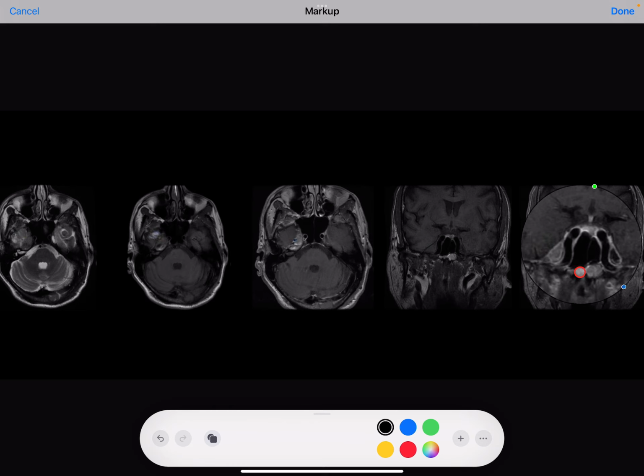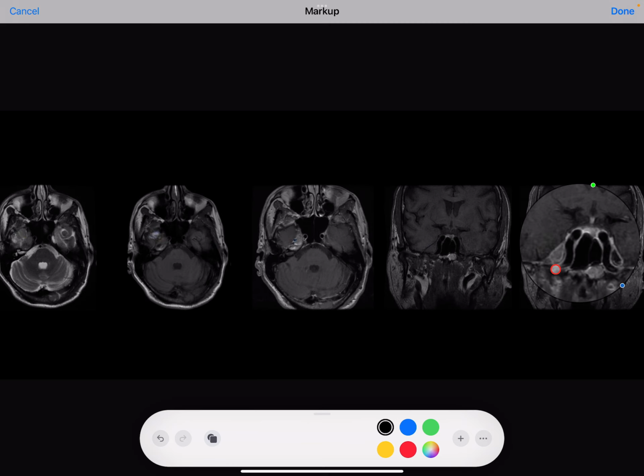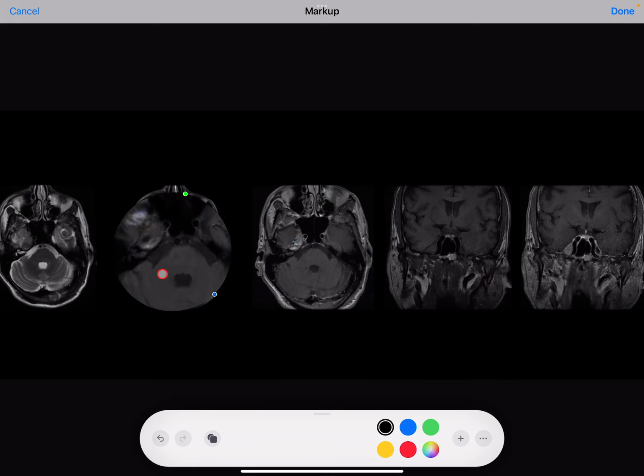What other differentials could there be for trigeminal schwannoma? It could be meningioma, metastasis, neurofibroma, any pseudotumor, and it could be neurosarcoidosis. So these lesions can occur in Meckel's cave. This mass lesion, trigeminal schwannoma, is giving the winking Meckel's cave sign, winking. Okay, so this is a case of trigeminal schwannoma.